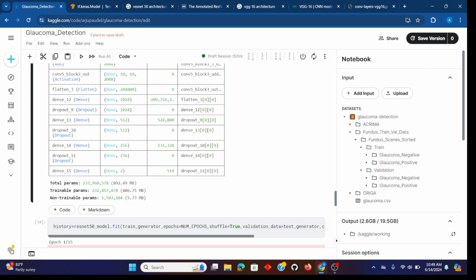We have to find the optimal values for each parameter to make our model perform better and better. After the training process, it will learn the values of these parameters, which include weights and biases, and in some cases I have seen optimizer parameters also. And you can see how huge the number is. So it's in MB, isn't it?